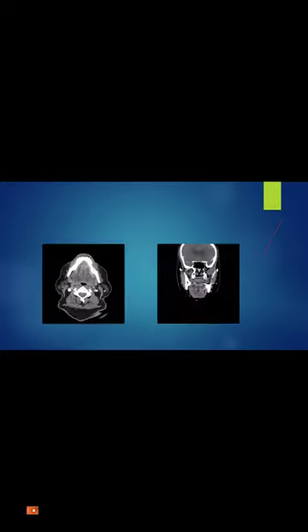How about this one? Aneurysm at left M2. Yes, MCA. That's true. That's correct. Small tubular lesion related to the left aspect of the mandibular body.